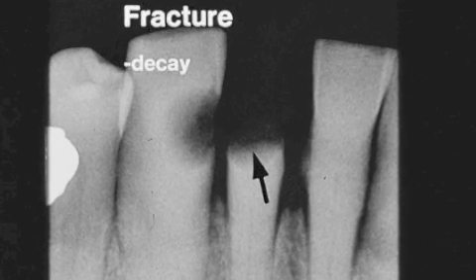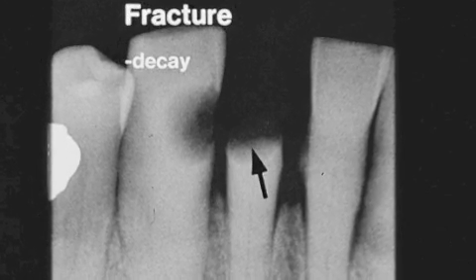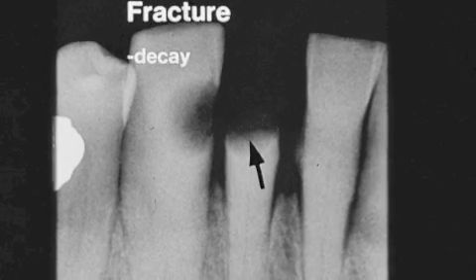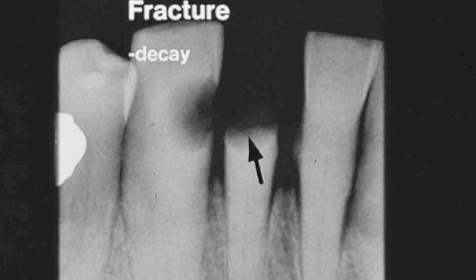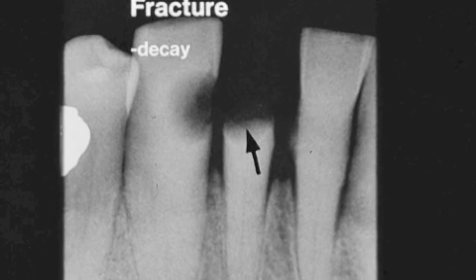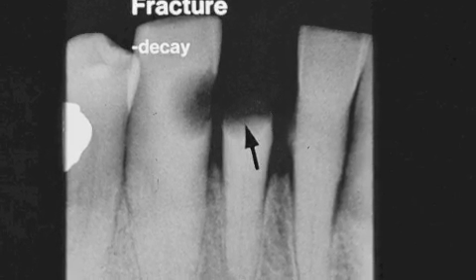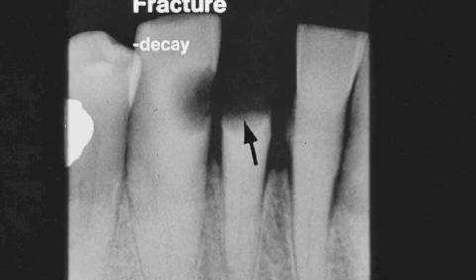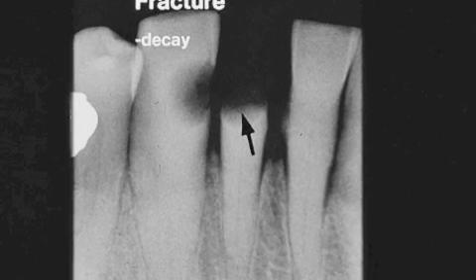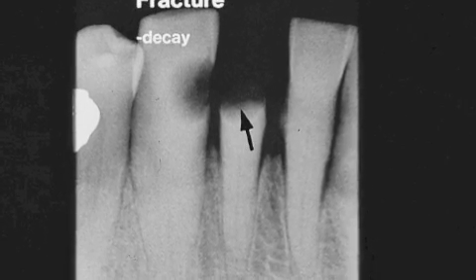The significance of tooth 26 is not the fracture but the severe caries. We see root caries on the mesial of tooth number 27. On the distal of 25, there is an opacity on the root. What is this? On the mesial of tooth number 25, we see severe bone loss by the radiolucency along the mesial root.